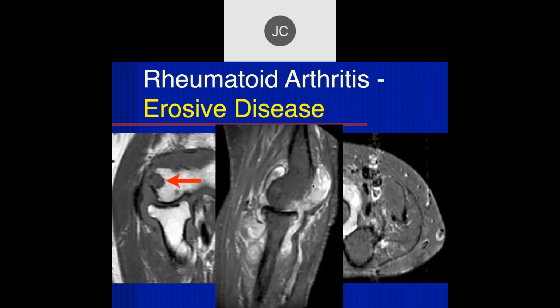It's very helpful. There are other synovitises that can produce erosions. Yeah, I know. But this is very, very characteristic of rheumatoid arthritis.